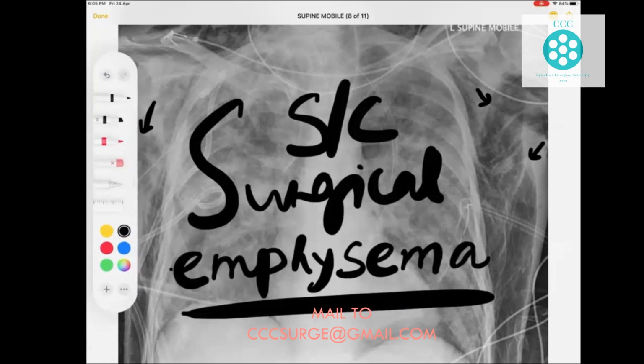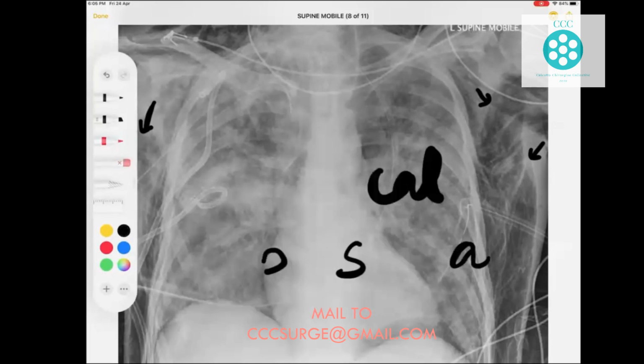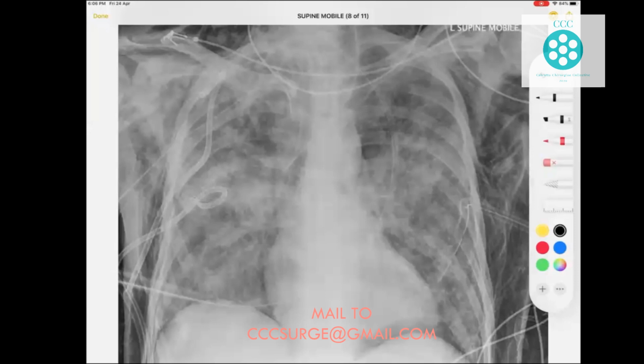So it is this. Number two. Beyond this, can you see any more things? Yes, sir, I can see more things, and there are more tubes than I could imagine. Oh my God, there are so many tubes. Sir, what are there? On the left, I can see that there is a tube. On the right, I can see one tube in this, another tube in this. God knows how many tubes this chap has put in. I can see multiple small lines, and these are maybe ECG leads that have been placed.